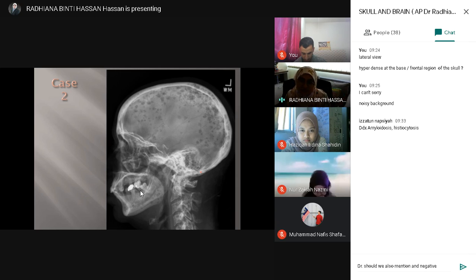Okay, so yes, there are multiple lytic lesions. Okay, you can see it's almost uniform in size. So this one is a very famous exam question in the books. If a radiology book doesn't have an image something like this, it would be strange. So if you read radiology books, you will surely come across this kind of image. Okay, so multiple lytic lesions.